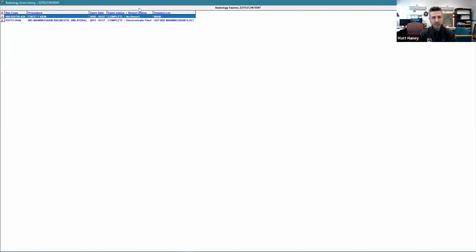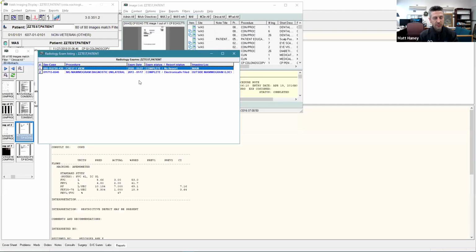There's an option in the imaging viewer that allows you to change the display ratio. I think it's View Settings. If you select that at the top, it's in the file, this kind of options menu. Select 2x1 and it will just go back to normal. And then you can look at a side-by-side comparison.